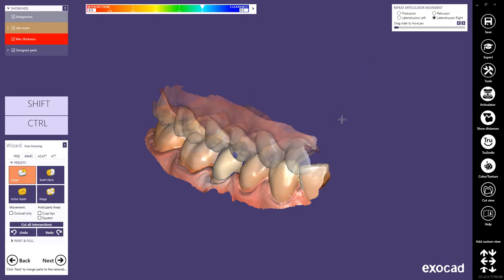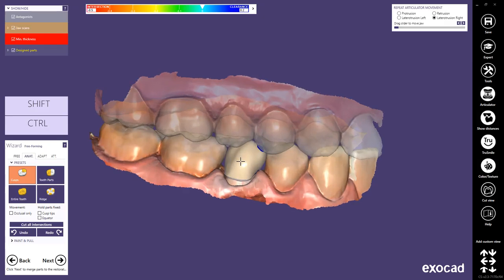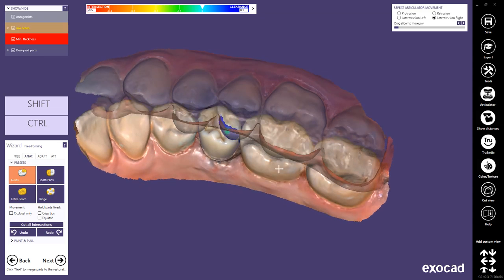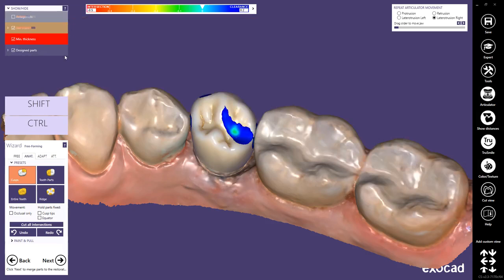At this stage, by accessing the free-forming step, Chairside CAD automatically adapts model teeth to the preparation margin, the antagonist, adjacent teeth, and, if applicable, pontics to the gingiva. This means that it cuts away existing intersections following the default value of material configurations from the manufacturers. Note: chairside CAD does not fall below the minimum thickness during automatic adaptation.